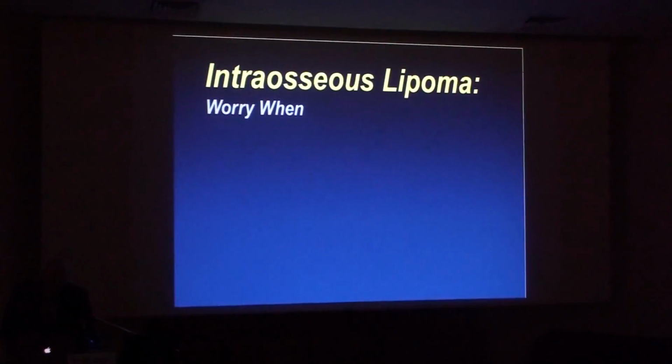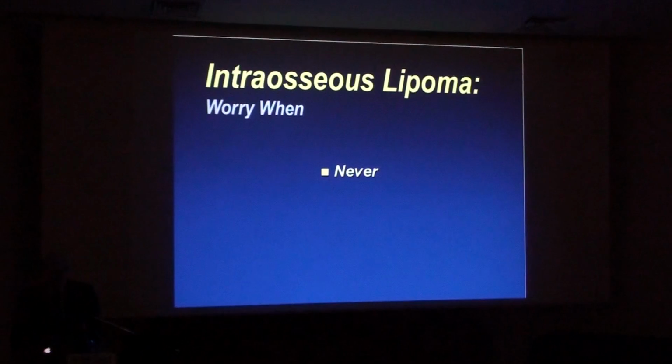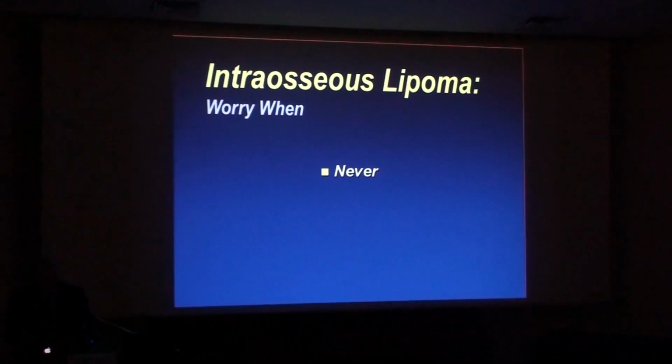So intraosseous lipomas, when do I worry? The answer is virtually never. When I see the fat within it, that's what it is. And you might say, well, wait a minute, liposarcomas metastasize to bone, and they do, but not well differentiated liposarcomas. It's always the higher grade, and when it's heterogeneous, it's the higher grade component that metastasizes to bone. And so while there may be some rare cases, they must be exceedingly rare, and I'm sure they may exist, but I have still yet to see one described. So I really virtually never worry when I see fat within the lesion.